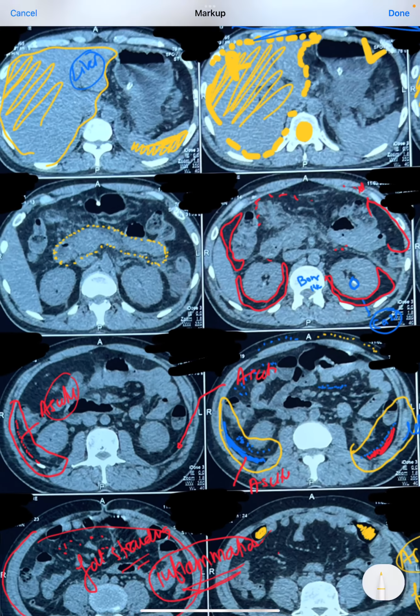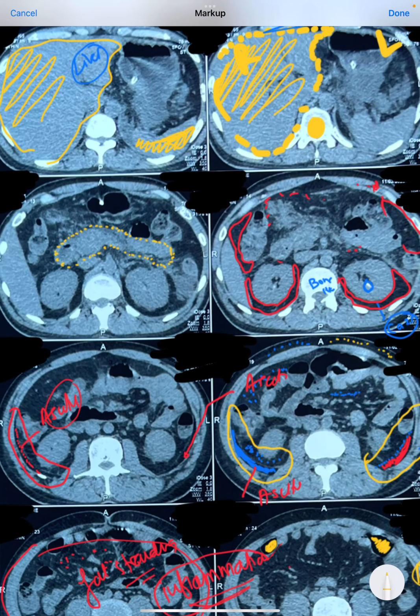That is the reason why the pancreas appears very shabby, the margins are irregular, and there is infiltration of fat around it. And you can get cysts, you can get necrosis, which will appear very much black compared to the density of the pancreas. You can get cysts or accumulated collections if there is necrosis and inflammation around.